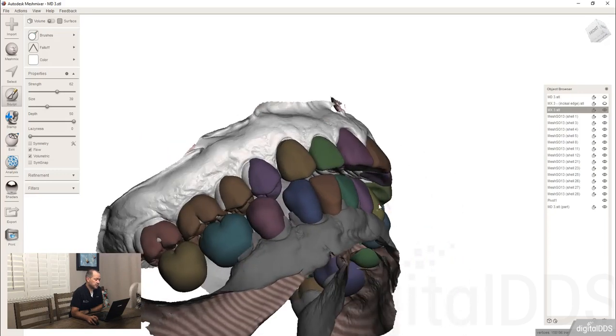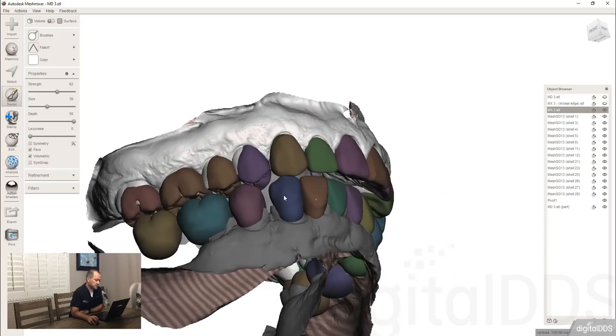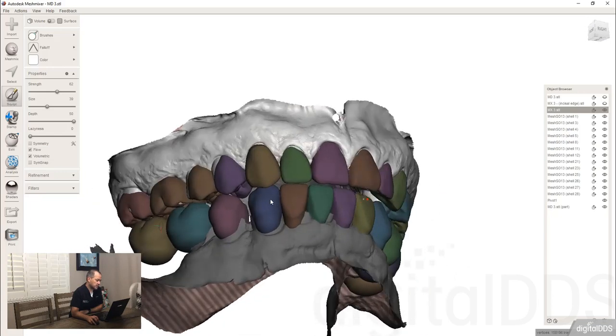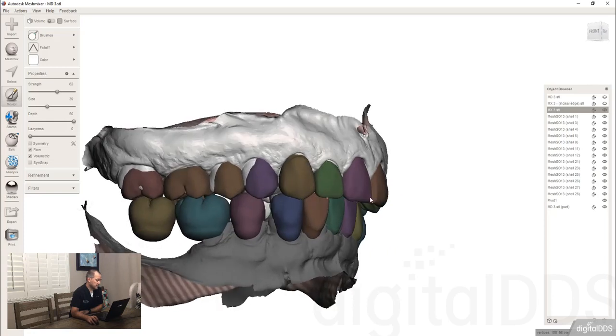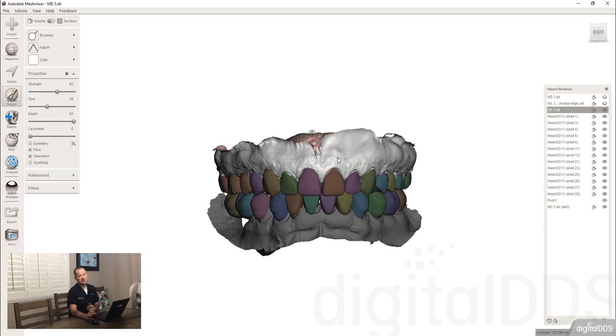And you'll notice he's going to have this overbite. I'd probably close the vertical some more because that seemed like a big gap to close. But you just keep messing around with it, and then when you're done, you add a base, save it out, combine everything together, and save it out as an STL file, so you're ready to print.